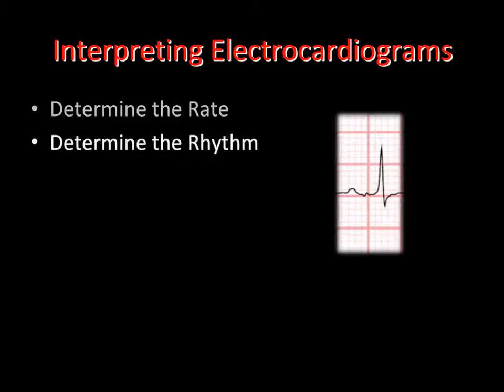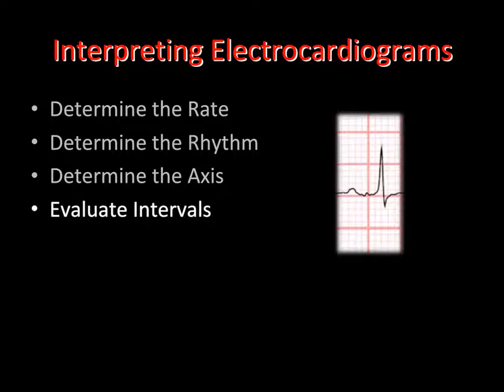The next step in the organized interpretation of a 12-lead ECG is evaluation of the intervals. As you might recall from Chapter 1, intervals incorporate at least one wave and an adjacent segment. Segments never involve the wave at either end of the segment, and durations are just the wave itself. In this chapter, we are going to focus on both normal and abnormal presentations of the PR interval.